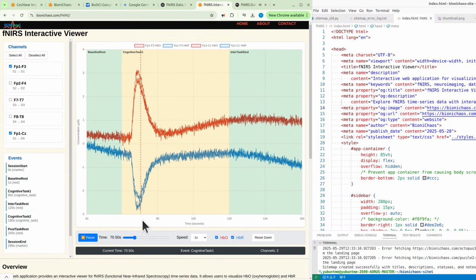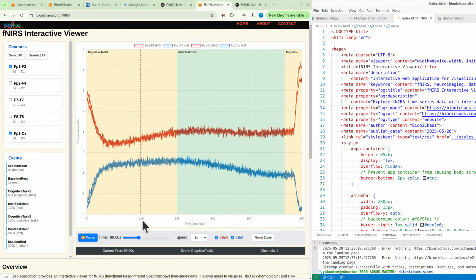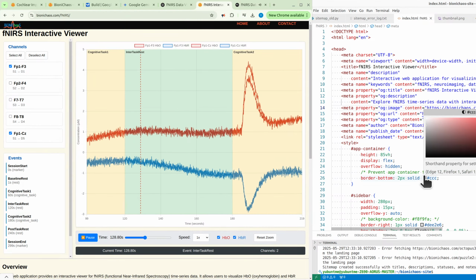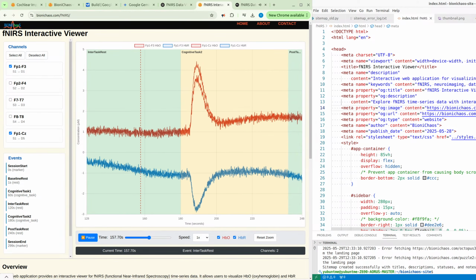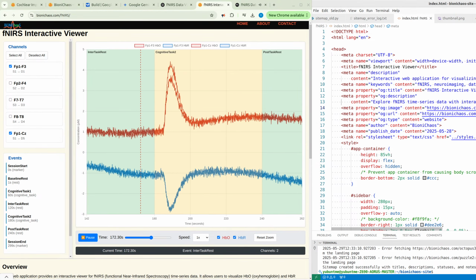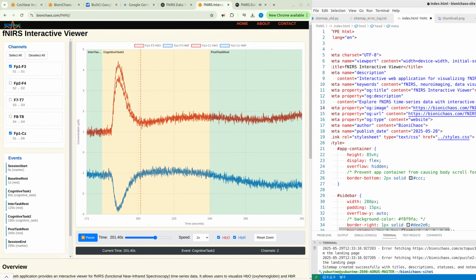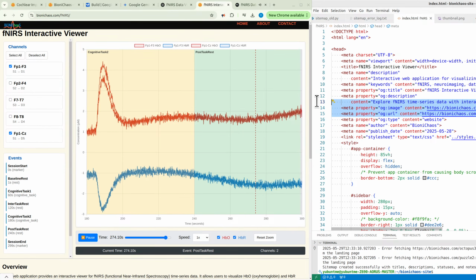Okay, so quite a deep dive there into one specific way to visualize fNIRS data. We've seen how this tool uses graphs, colors, and interactive controls to track brain oxygenation, changes, our window into activity during different experimental conditions. And tools like this are really essential. They bridge the gap between raw, complex signals and actual scientific insight. They make the invisible, well, visible and navigable. Right. Turning that complex data into something you can actually explore and understand. Yeah. It helps unlock what the brain is doing during thinking, resting, reacting. Exactly. Finding the patterns in the noise.